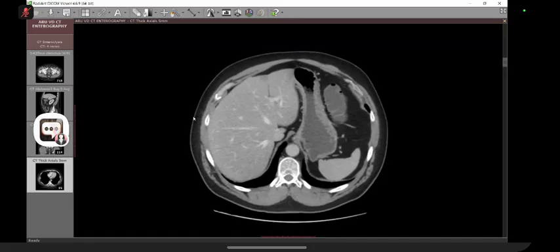But the idea is that I have selected a single CT scan, and on the same CT scan, consider it one patient, right? On which I will teach you stomach and duodenum during this session, small bowel during the next, and then the large bowel, and then the hepatobiliary and the pancreas. So you are going to master CT, that is the aim. And please remember, if you don't know your normal, you cannot know your abnormal. So that's the idea.